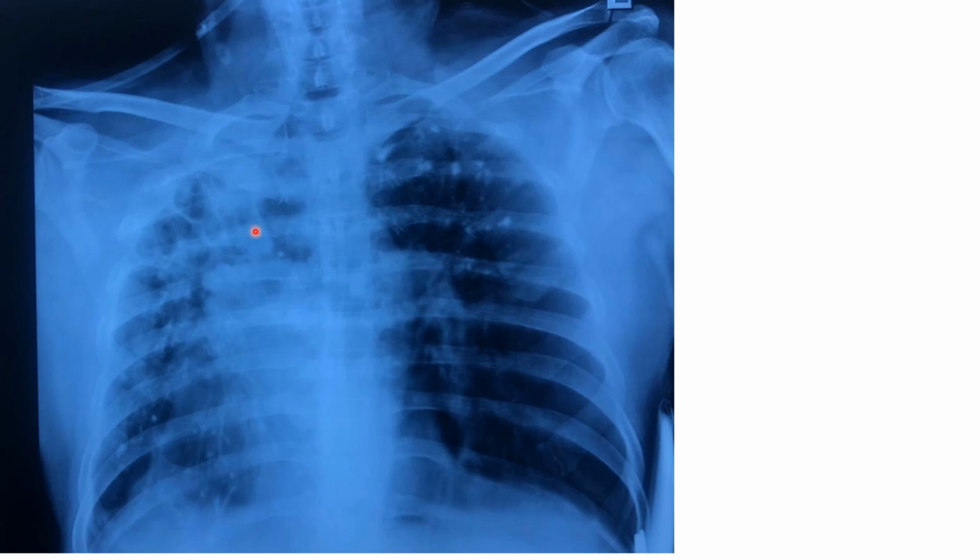Another notable thing is that because of this fibrosis and volume loss, you can see that the cardiac shadow is pulled towards the side, because this is the left side and this is the right side. Normally the cardiac shadow should come somewhere here. If the lung is okay, then there's no issue, so it should be on the left side with the apex somewhere up here. Now this entire thing has been shifted to this side, right? The lung is quite visible till this space. That is because this fibrosis has pulled up the mediastinum.